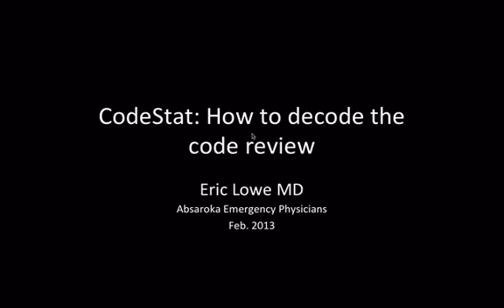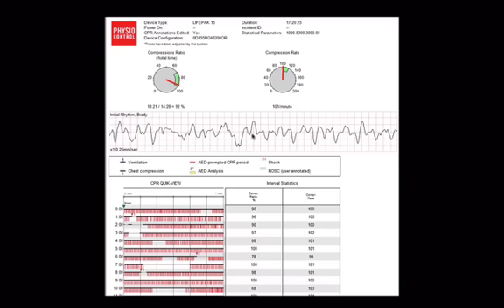Hello and welcome to a quick intro into how to interpret the CodeStat code review reports. I'm guessing, since you're listening to this, that you've received something like this, and what we're going to do is quickly go over just what you should be looking at and how you should interpret this.